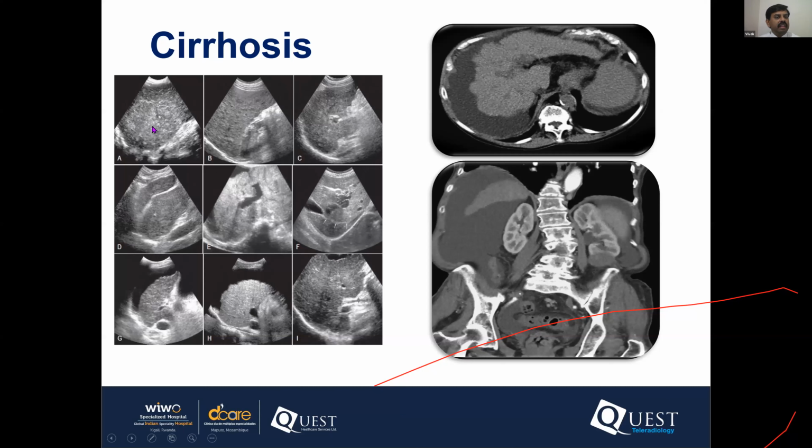In cirrhosis, what happens is that the liver becomes more fibrous and more scar tissue is formed and it loses its elasticity. So here what we see is the coarseness of the liver and there may be nodules. Nodules may be less than 3 mm, micronodules, more than 3 mm, a few centimeters, that is macronodules, or more than 5 centimeters, which are giant nodules.